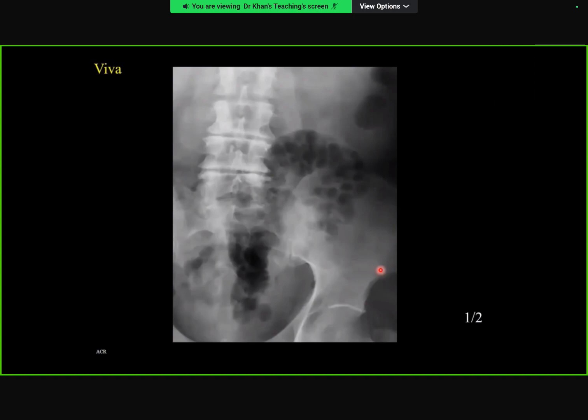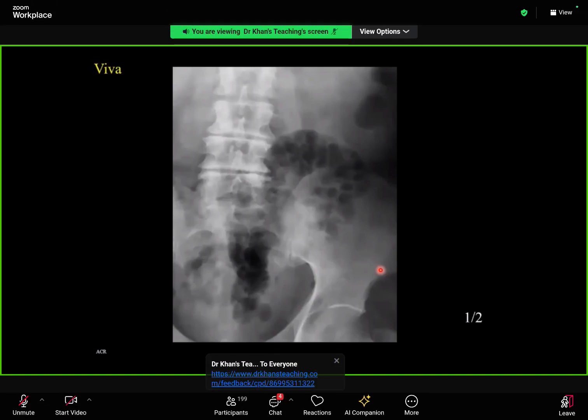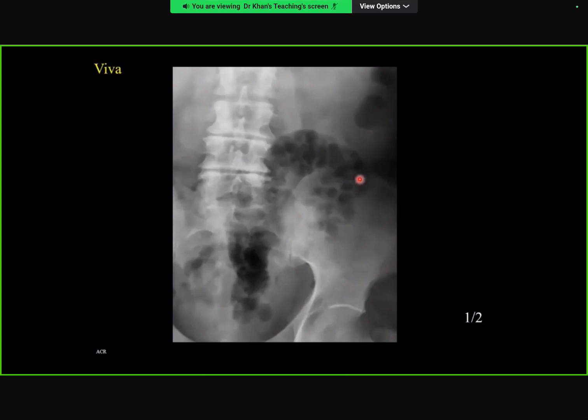Okay, this is a coned-in abdominal radiograph. There's a dilated loop of bowel with multiple locules of gas within the bowel lumen, and there's some locules of gas also near the inferior portion of the film that seem to be just projecting from the bowel wall.